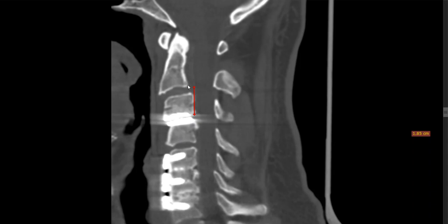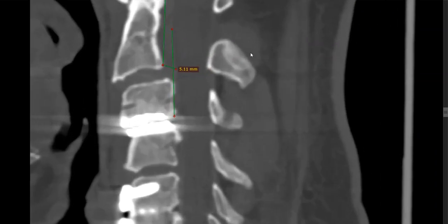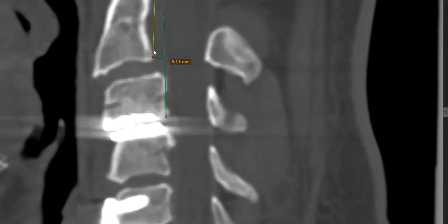But the significance of this space here, if I take a look, I'm not going to count the backside calcification here. Let's just zoom in a lot more so we can get detailed, and I'm going to be very, very kind here, and what I mean by kind is making it extremely accurate.